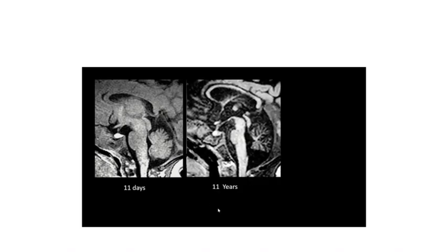So here at 11 days of age, that looks like a hypoplasia because it does not reach the superior aspect and there isn't much of interfolial separation or fissural widening. But what happens at 11 years? So now it looks like a significantly atrophic cerebellum. So it looks like hypoplasia to start with and progresses to have an atrophy-like morphology.